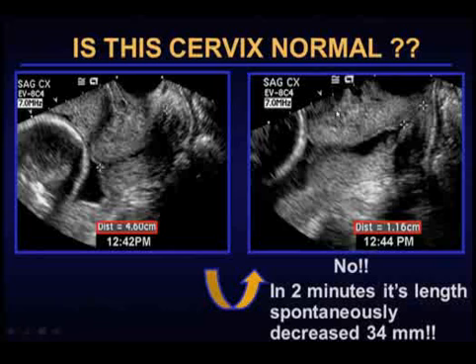When you put the vaginal probe in to do this, don't just put it in and then pull it out 10 seconds later, because it's my general feeling that when you first put that probe in, the cervix, if it was dilated, may decide it doesn't like the probe in there, and it starts to go back to a more normal appearance. So when you put the probe in, I would suggest you keep it in for at least 1 or 2 minutes.